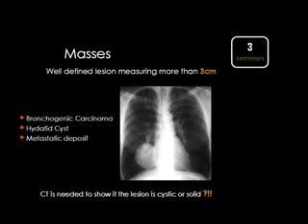Good. That's to say, if we are looking at the chest X-ray and you see a pulmonary nodule or nodules, you have only very commonly one of 6, and the differential diagnosis is easy. Now we came to the masses, and you see the mass is a well-defined lesion that is more than 3 centimeters in diameter, and the masses that are common in the lung are only 3.